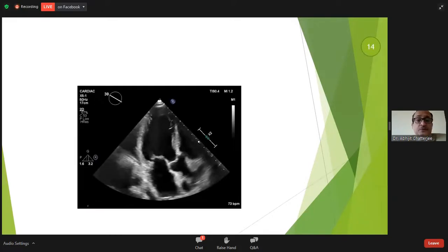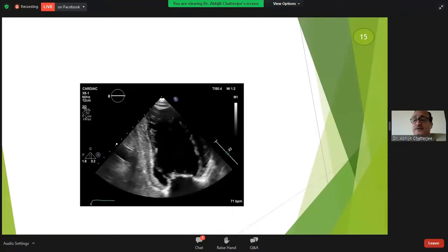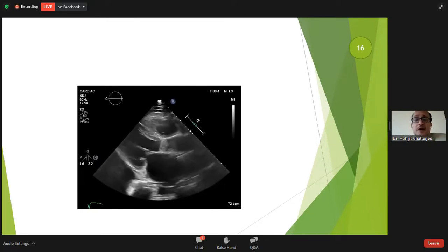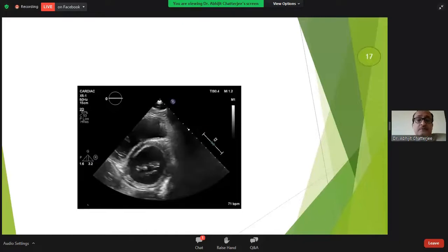A three-chamber view. See the poor contractility, but the apex is akinetic. Other segments are moving well, especially at the base. Same patient, see the dyskinetic effects, and there is a suggestion of an apical thrombus. Same patient, parasternal long axis view, very poor contractility, and look at the posterior wall, posterior inferior wall, there is thinning, scarring, and akinesis. These are characteristics of ischemic dilated cardiomyopathy.